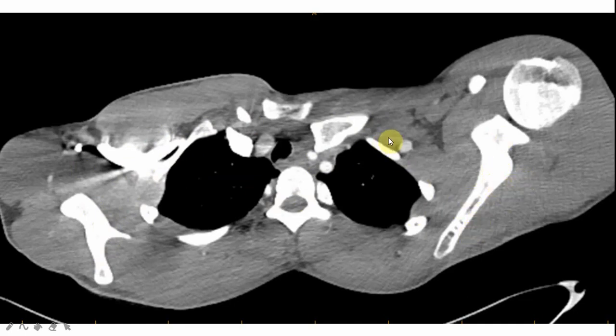So my diagnosis from this particular section is there is a 100% posterior displacement of the medial end of the clavicle. So this is a posterior dislocation of the left sternoclavicular joint with some amount of effacement to the left common carotid artery. This is an emergency, and we need to get it fixed as soon as we can.